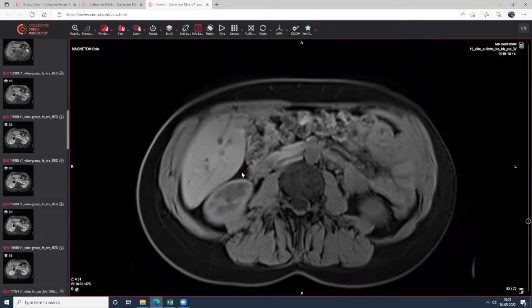But the thing is, an FNH, even with extracellular contrast, tends to be slightly hyperintense on the delayed phase. Your adenoma tends to be iso-intense or slightly hypointense. Also, if you have a T2 hyperintense scar, then you're almost certain. But it's harder without Primovist.